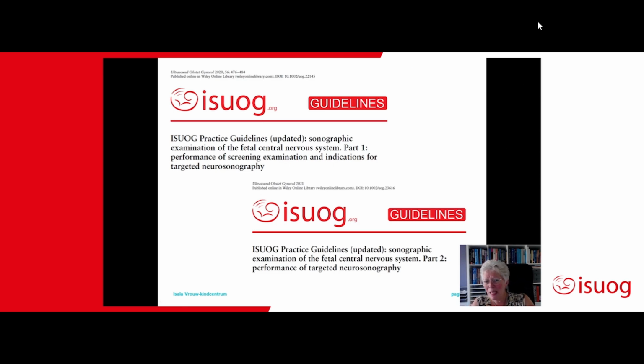The fetal brain is, I think, one of the most interesting parts of the fetus, but also one of the most challenging parts because its appearance changes during pregnancy and during development, which makes it a lot more difficult to assess.